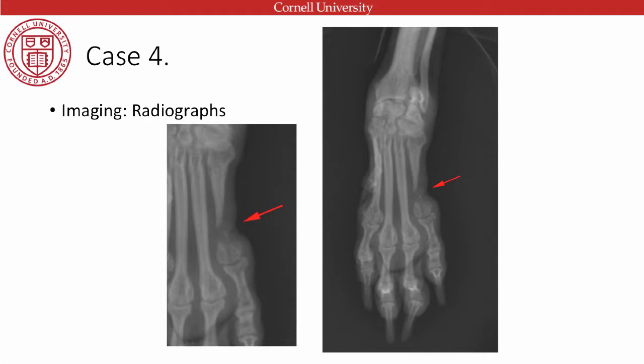Distal limbs in Yorkshire Terriers are poorly vascularized, and they struggle to do well after fracture repair. So perhaps this won't grow back. So the option is, do we go in and amputate the digit at this level, or do we go in there and try and repair it? So she's got vascular constriction and hypovascular related necrosis of that distal metacarpal bone here.